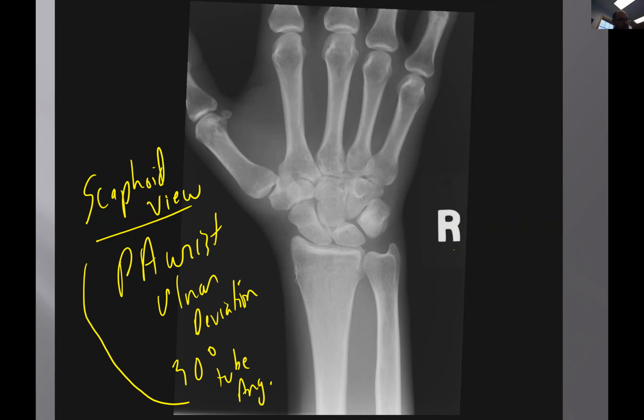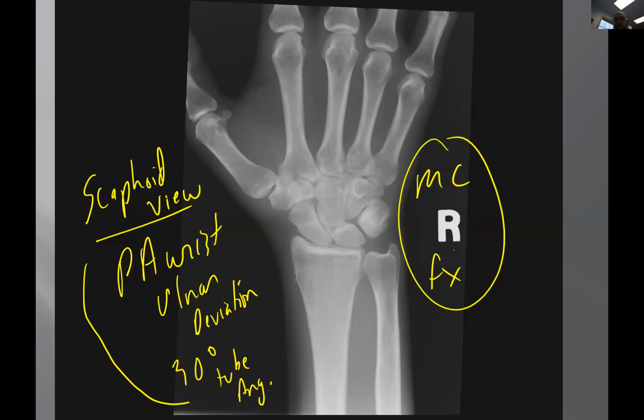So, guys, the most common fracture of the wrist, and this might show up somewhere in a little quiz coming up, is the scaphoid fracture. If they have pain in that snuff box, you've got to take a scaphoid view. These are almost impossible to see without the scaphoid view. And if you're not certain, spend some money and get an MRI. These don't heal very well if you delay. So we're going to do that. All right, good feedback.